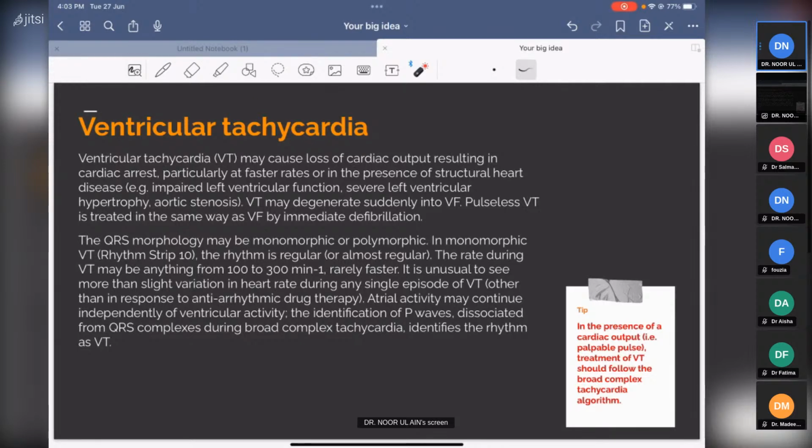सही है. और ventricular tachycardia के different, like when you see the strip for ventricular tachycardia, the rhythm can be so many different forms, like monomorphic or polymorphic. Morph is Latin for shape. जी, I will come to SVT and VT. SVT का proper हमने बात करनी है because SVT is one of the most important ECG strips for SMLE. वो इसके बाद मैं बताती हूँ.